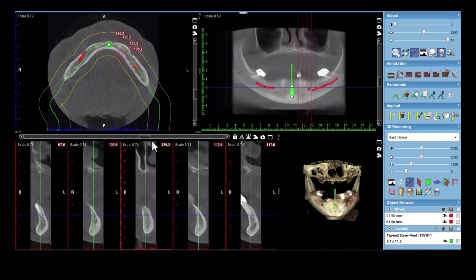All right, so usually what I'll do here is then, I've got those defaults marked. So I'll just come here, put one there, one here. Okay. All right. And then we can do these straight.